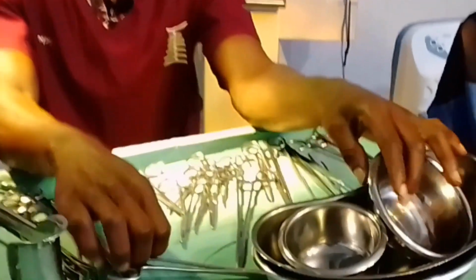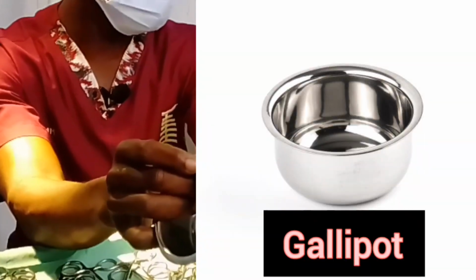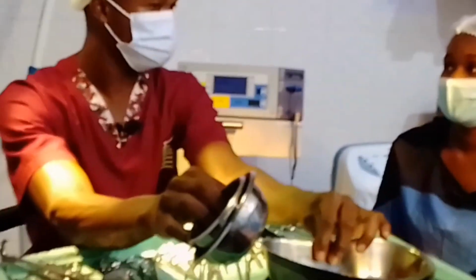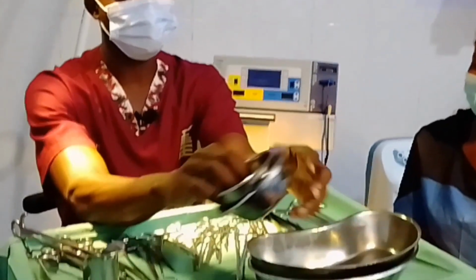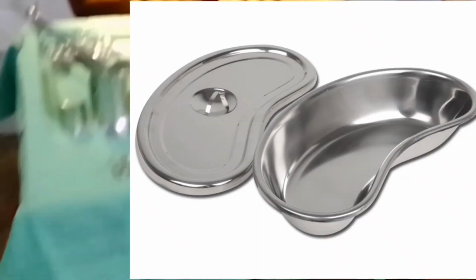You have the gallipot and the kidney dish, you all know. These are for the solutions. The solution that you use to wash the incisional sites, and these are for the saline and the spirit. And these are just the receiver, the kidney dish. So basically, that is all for the instruments.